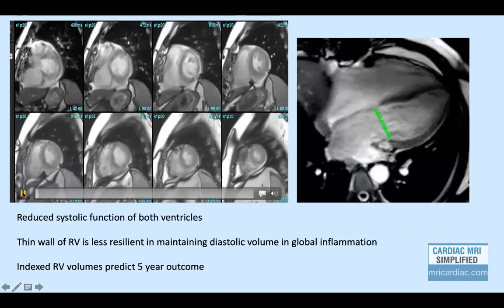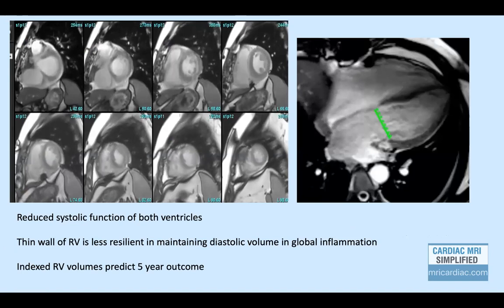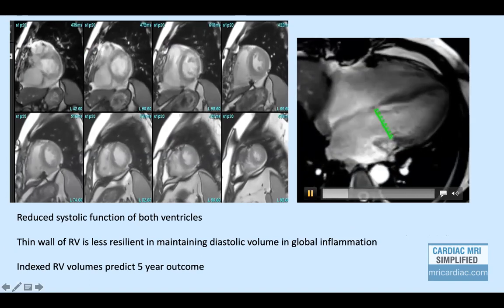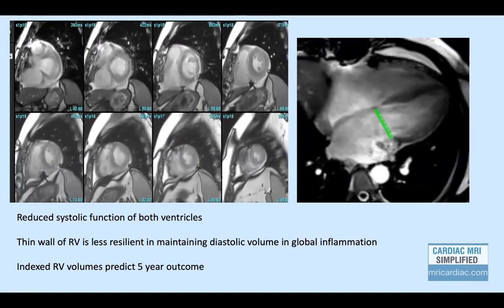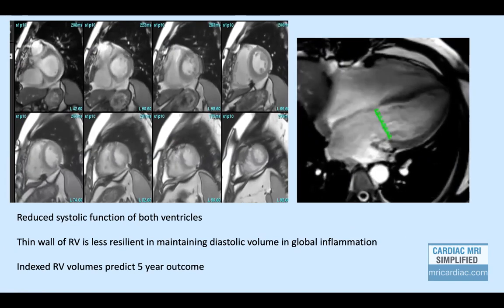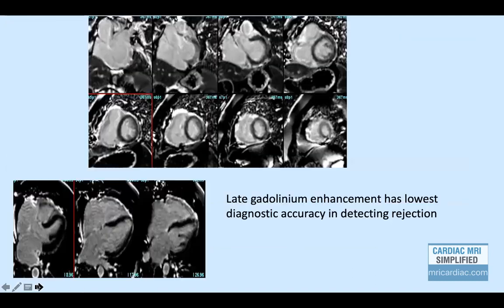Systolic function of both ventricles can also be reduced. More than the left ventricle, the right ventricle is involved because the thin wall of the right ventricle is less resilient in maintaining diastolic volume. Indexed RV volumes predict 5-year outcome. So it is important to accurately detect the volume and function of both ventricles. Late gadolinium enhancement, though routinely obtained, has very little sensitivity and diagnostic accuracy in detecting rejection.